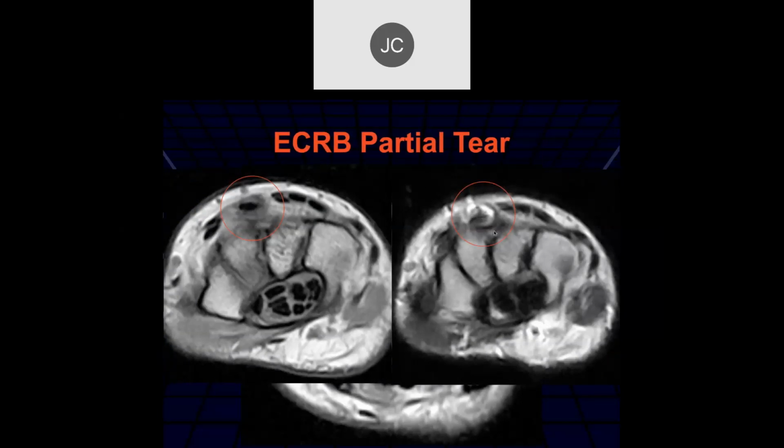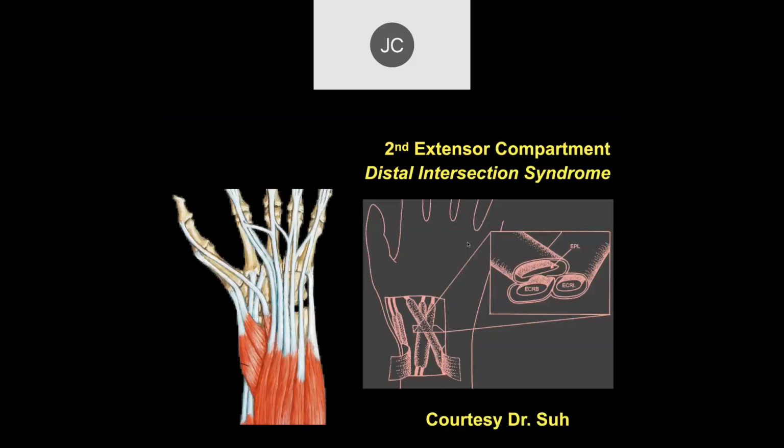And one of the easiest things to miss in the wrist is when you have a complete tear and there's no tendon. So looking again at the tendons here. Here's the first extensor tendons coming across here. The second extensor tendons coming here. The third extensor tendon, which is extensor pollicis longus, coming across here. And then again, you can get intersection syndromes here and here. And then the fourth are the bulk of the extensor tendons here. The fifth is the extensor digiti minimi, and then the extensor carpi ulnaris over here.